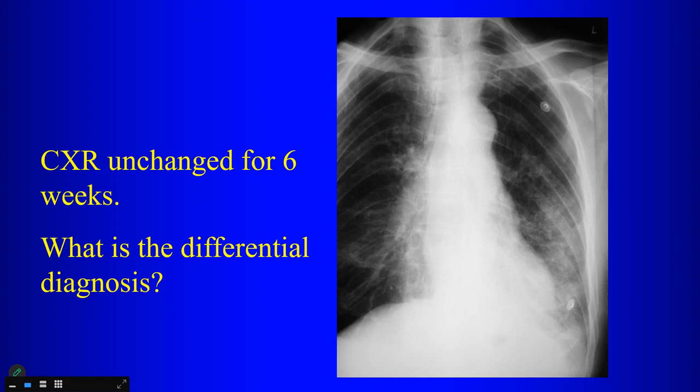Bronchoalveolar carcinoma. Yeah, so-called bronchoalveolar carcinoma, although that term is no longer used. So what you want to say is what? Well differentiated adenocarcinoma. Well differentiated or mucin producing, if it presents as a consolidation like this, a mucin producing adenocarcinoma. What else can be in your differential?